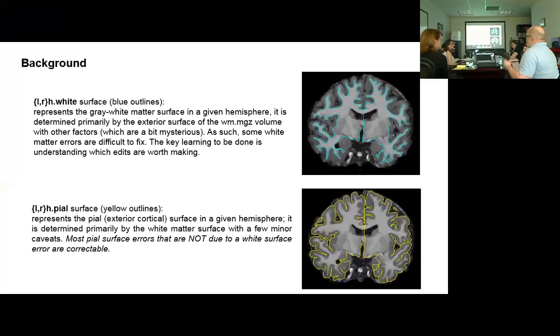But you'll see the motion is more widespread because we've got kids that are under 4 years old. The main issues you're going to have are in trying to fix that white matter volume, the white matter segmentation, to try to improve its labeling of the white matter.